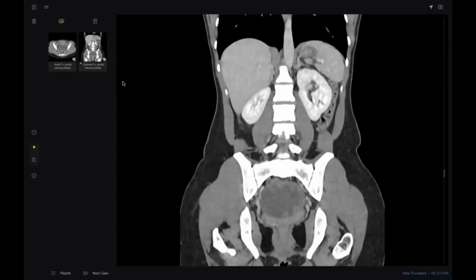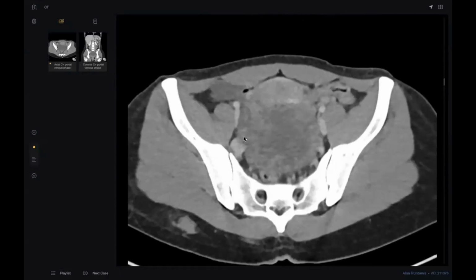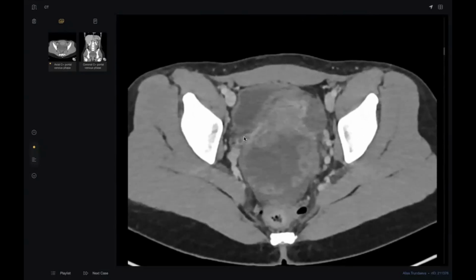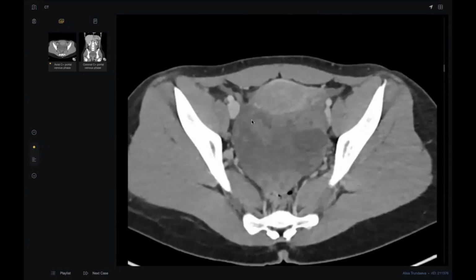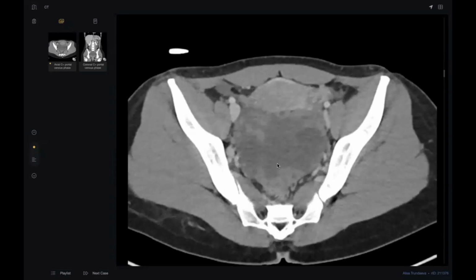What happened here, my colleague? Doctor, we can mistake this as cystadenoma. Okay, this is all right. But see, the location is very characteristic. Where is the location? Between the rectum and the uterus. Even if any cystadenoma is located in this location, consider torsion. And suppose there is a tumor here, this ectopic or abnormal location is a very common sign of torsion.